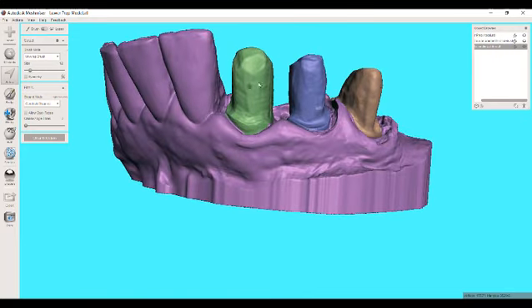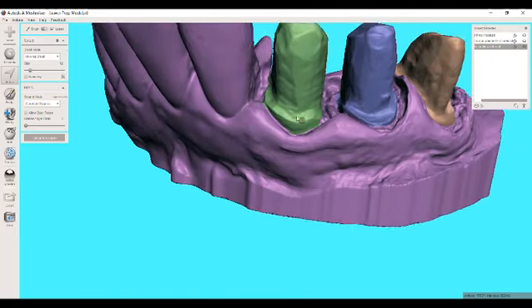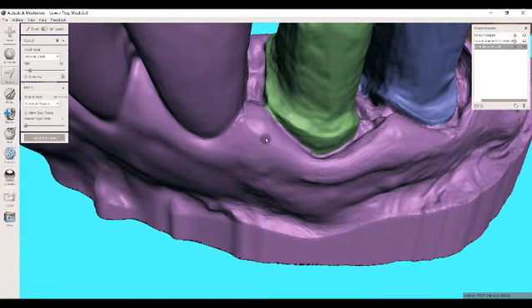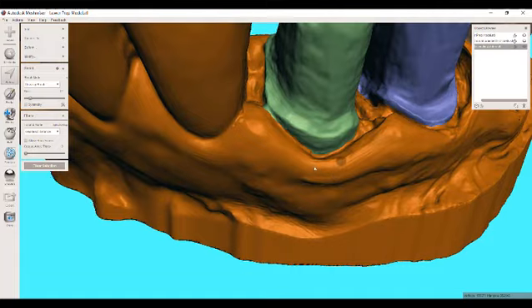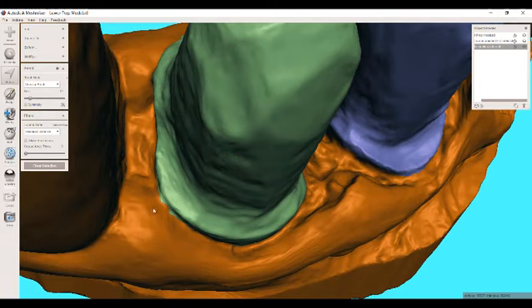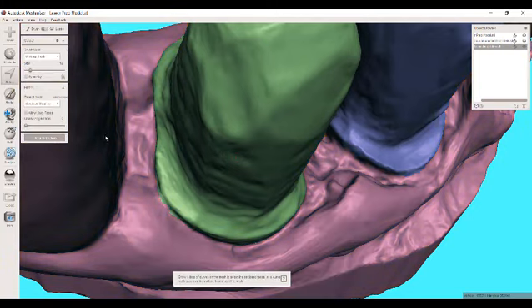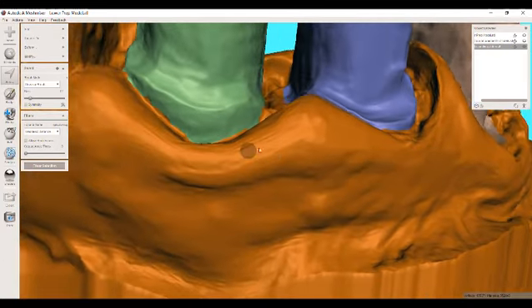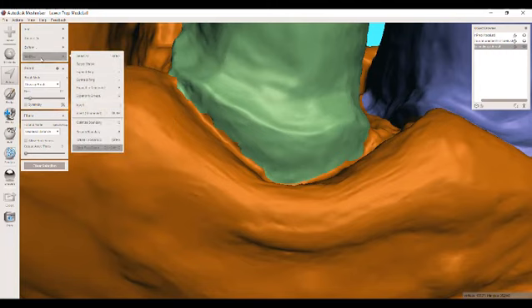Okay, or well, I guess these are three different colors, but what I can do now is let's determine how big of an area we want to ditch around the models. Okay, so I'm going to select the main model, and then I'm going to contract the boundary. Now what I mean by contract the boundary is, I've got all of this selected, and now watch what happens. I'm using the hotkey. You can do this under modify, contract ring, but you see the little hotkey there, hold shift and hit your less than.